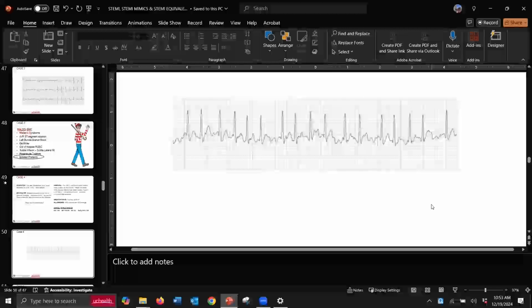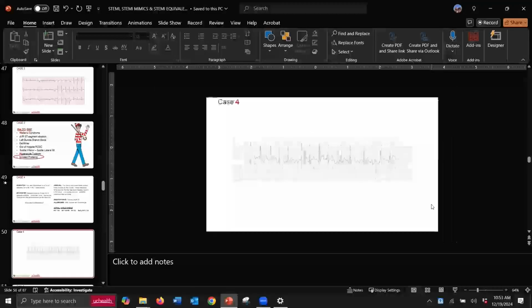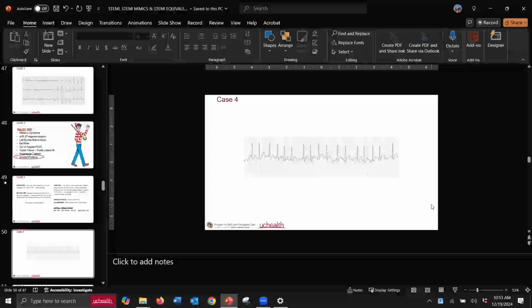I'm going to put my hat on AFib. So we see AFib on a 68-year-old. We're like, yeah, people live with that every day. Do you have a history of AFib? Did you notice he wasn't anticoagulated? Oh, he kind of was anticoagulated because he takes 81 milligrams of that. Is that AFib anticoagulation? You shake your head, no. Probably not. I would consider this possibly new onset.